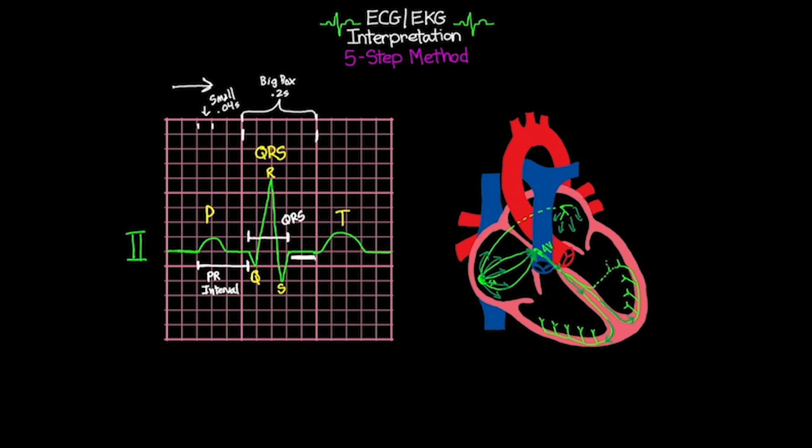And as you can see here in our example, after we went through the entire ventricular depolarization, we came back to that isoelectric line before going to our T wave. And so sometimes you might see a depression of this ST segment, or sometimes you might actually see an elevation of the ST segment. And these are important to monitor for because they can be signs of either myocardial ischemia or myocardial infarction when we're looking at the elevation side of things. But again, I just wanted to make mention of that. We're not really going to talk about that any further in this lesson.